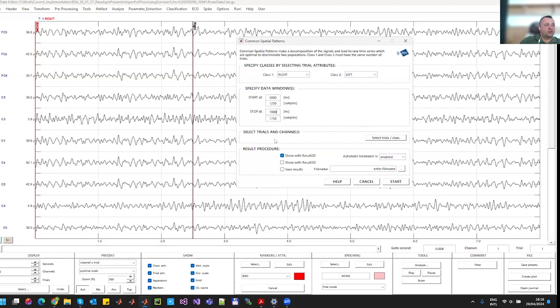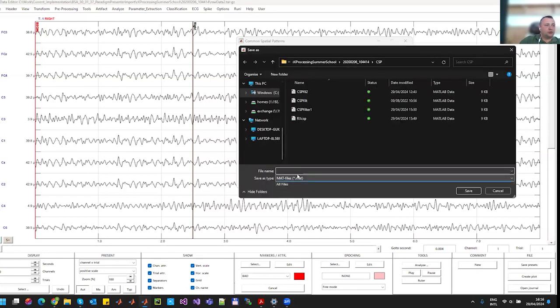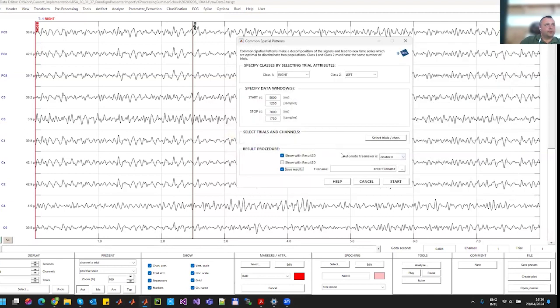And I will save these results. Okay, and start.